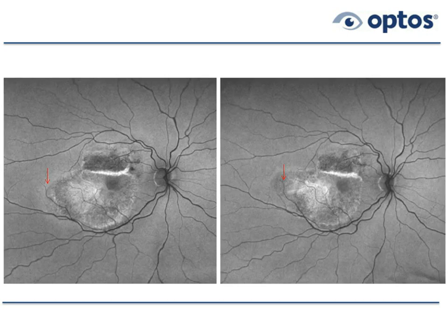And we could use autofluorescence, as we also use OCT, to tell us whether the condition is changing. Here on your left, you can see where the red arrow is, and that shows you where the lesion goes up to. About a month later, we have that red arrow at the same blood vessel, and we can see that the lesion, the abnormality at the level of the retinal pigment epithelium with the abnormal autofluorescence, extends further temporal than that. So it's very simple to use these images over time to show change. And that may suggest that the patient needs additional treatment.